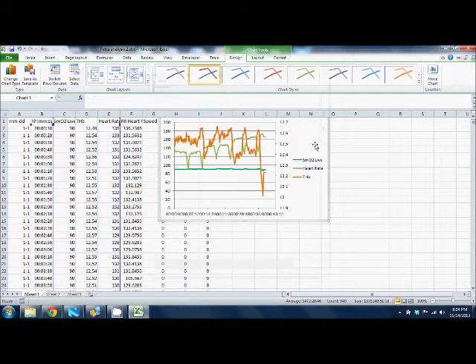And then it plots the THB on an axis on the right side of the graph, and you can see it chose to auto scale this from about 11.9 to 12.7, so that helps blow up the THB so it's a lot easier to see. And then in this case, the SMO2 data was very close to 90 for this entire test, and so you can see that's where it's plotted.